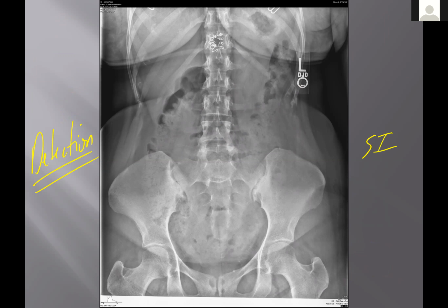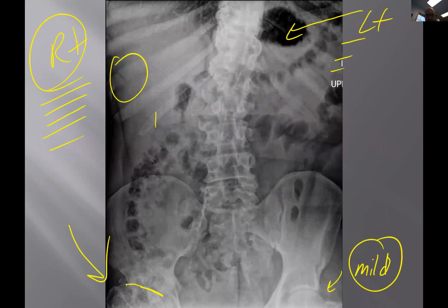Lumbosacral juxtaarticular sclerosis there. Yeah, there's some changes there, but also take a look at that symphysis. There's some pretty big lucencies around the symphysis pubis. So in the ring, you've got the SI problems, and also some problems in the symphysis pubis here. Now, if I were to tell you that the SIs themselves, now watch this. Whoops, let me get back to that. I want to blow that up for you.